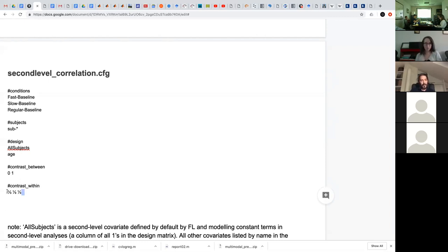If instead of that you enter in here 1, 1, 1, that's perfectly fine. The statistics are going to be the same. The cluster level statistics are going to be the same. P-values are the same. Everything is the same except effect sizes. If you look at the effect sizes within a cluster, you would interpret those numbers as the sum of the activation across these 3 conditions instead of the average. So it makes interpretation of effect sizes a little bit more difficult.